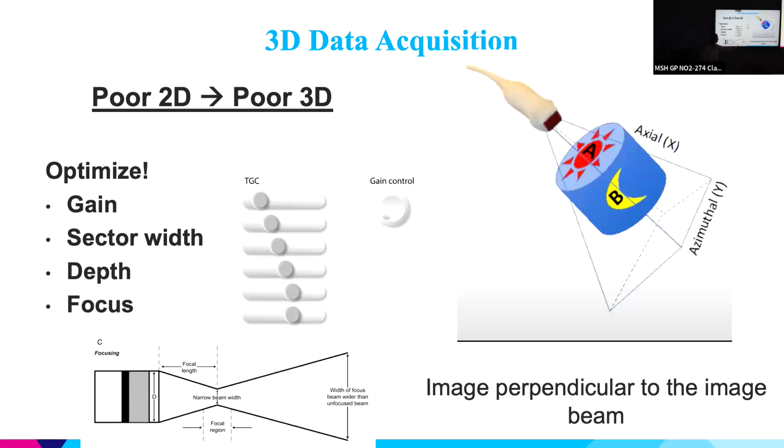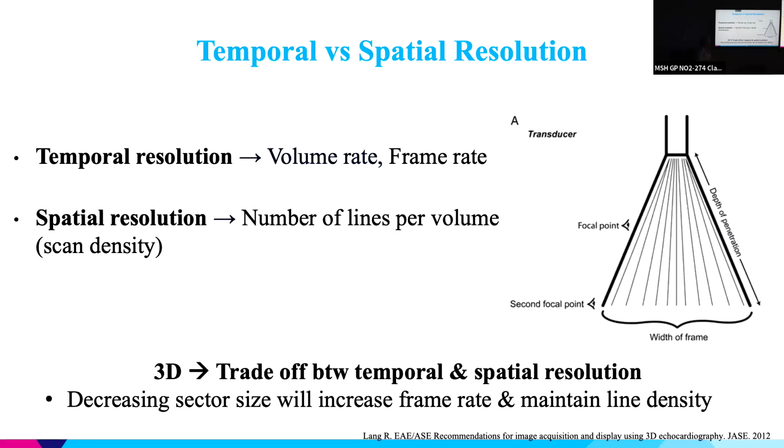That's where the ultrasound beam is primarily focused. When you image in the far field, you're going to be decreasing your resolution. So if you're imaging a mitral valve and your focus is at the top of the screen and they never touch the focus the entire study, you're really doing yourself a disservice, because what you're imaging is not in the focal zone. You want to make sure that you have your focus exactly where what you're attempting to image is.